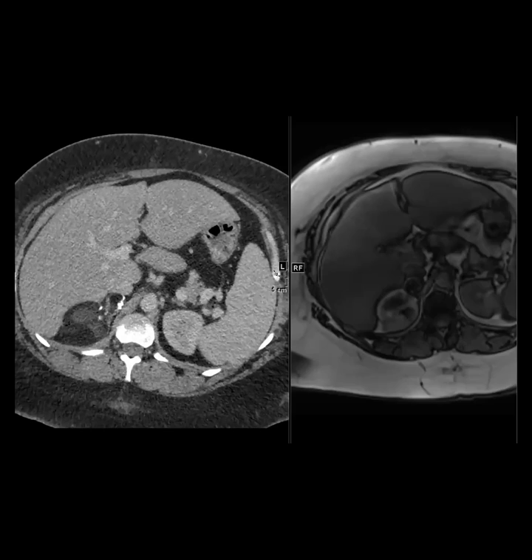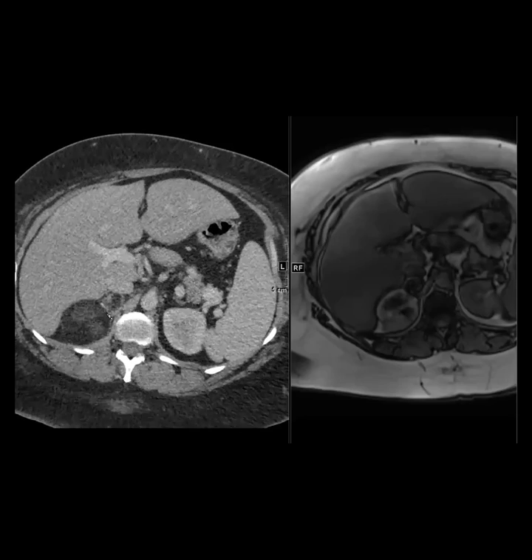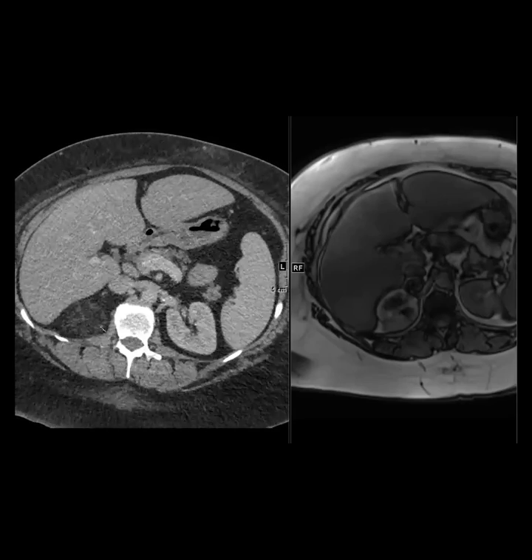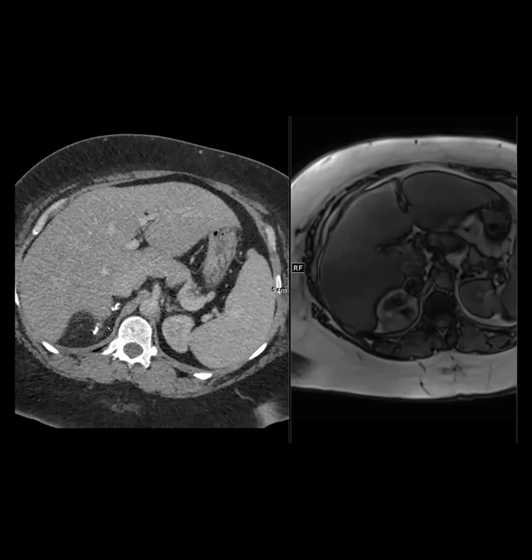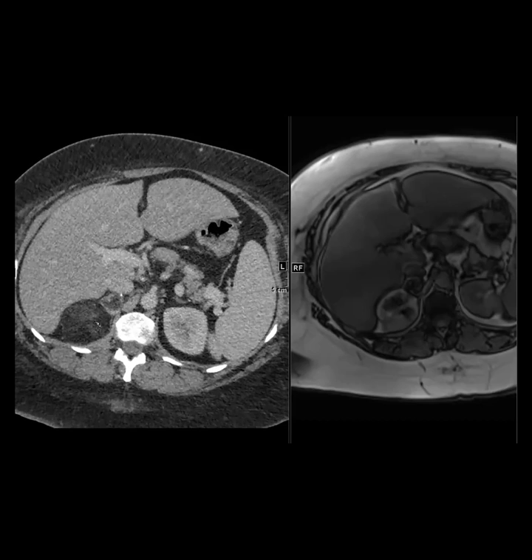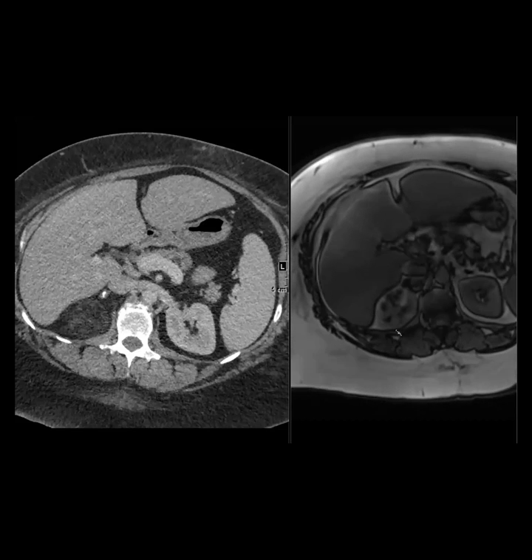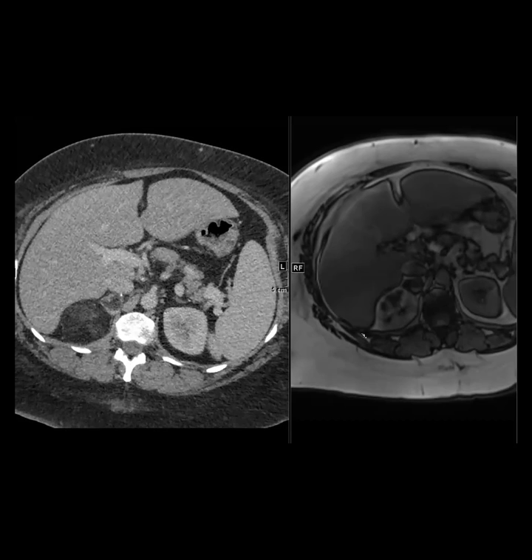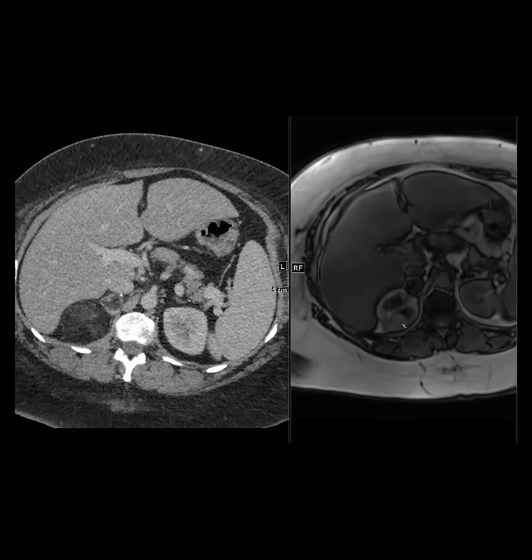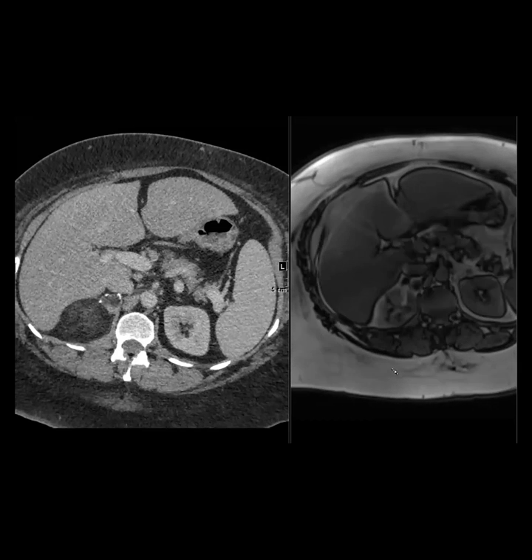Next case is this one. This is a patient with this fatty lesion in their adrenal gland. It has some dystrophic calcifications, but it looks like a classic myelolipoma, because it has this bulk fat and then the smudgy stuff, which is the myeloid components. On the out of phase, you can see that there is that interface and loss of signal where the fat is interfacing with the myeloid components. Whereas back here, where there's interface between the fatty lesion and the fatty retroperitoneum, there's actually no interface.